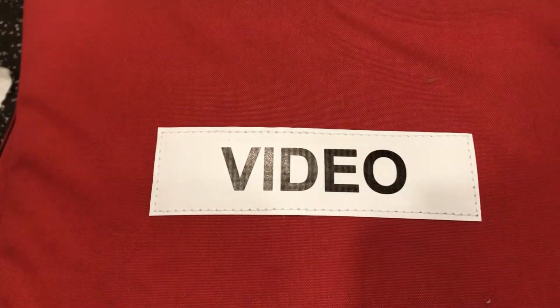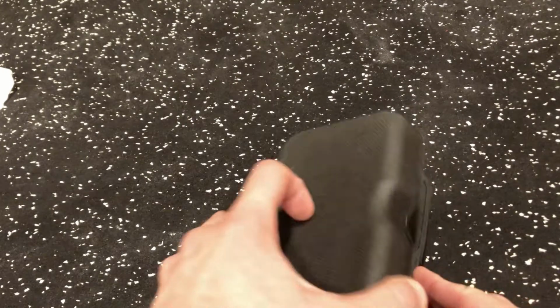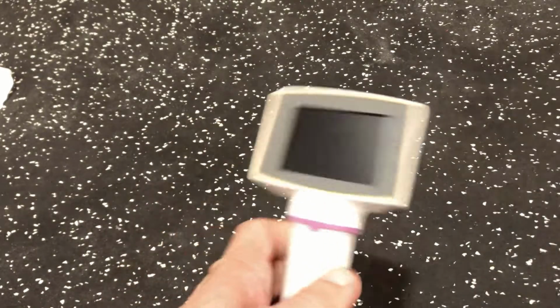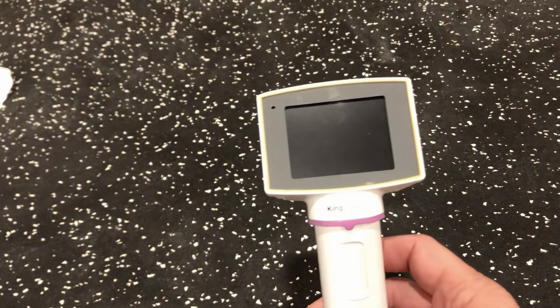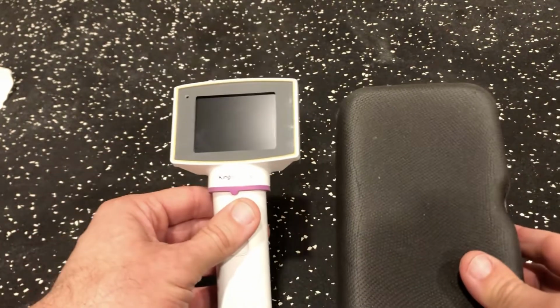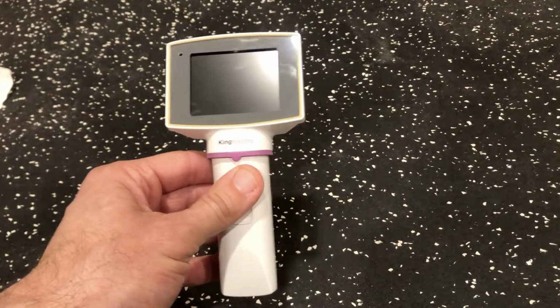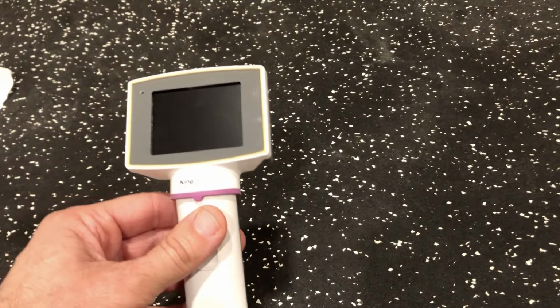Another tool that we have in our office, and you'll want to at least familiarize yourself with where it is, is what is called the video laryngoscope. It comes in this red bag. And it's not important that you know exactly how this particular airway device is used, except for the fact that you get it to our hands quickly. It's going to be apparent that the doctor knows how to use this particular tool. In the red bag that we just showed you will come the video portion of the laryngoscope, as well as a couple different options as far as what we would use for intubation.